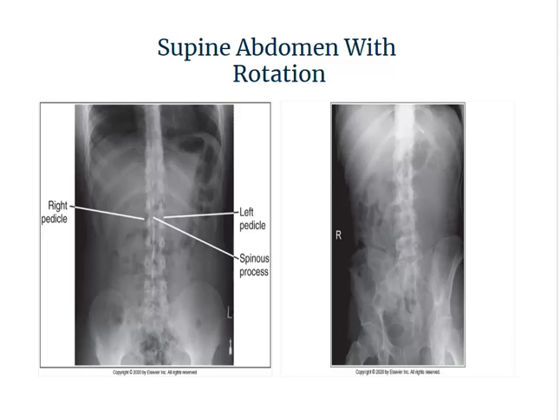You should evaluate the entire spine, because from the thoracic spine all the way down to the upper lumbar to the sacrum and coccyx, we can shift our hips and still have the upper half of our spine in alignment. So you have to really look at the entire spine to ensure that there is no rotation.